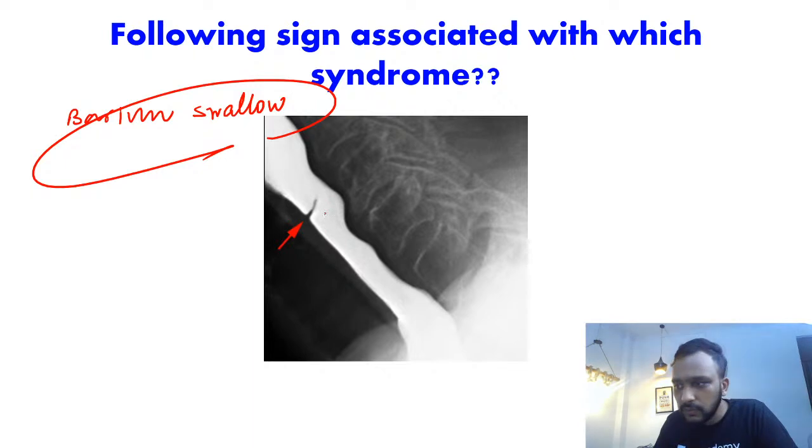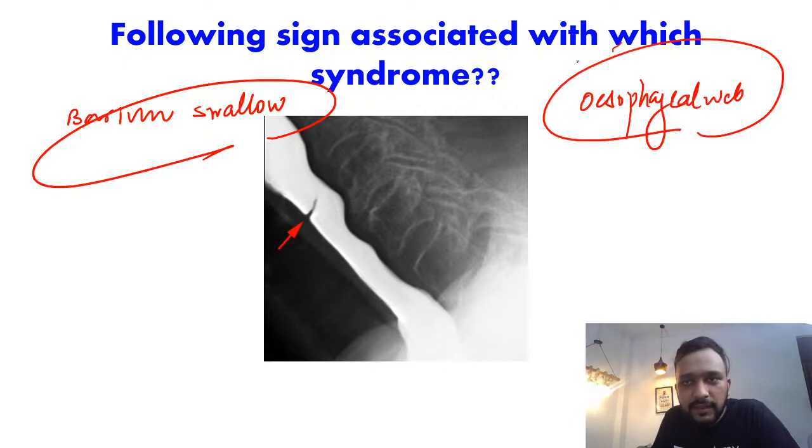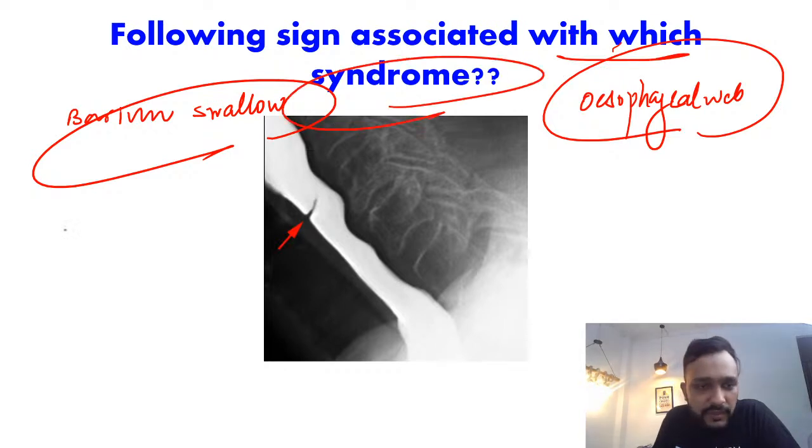So this was a case of esophageal web, and the question that has been asked to us is, this following sign is associated with which syndrome? It is associated with Plummer-Vinson syndrome.